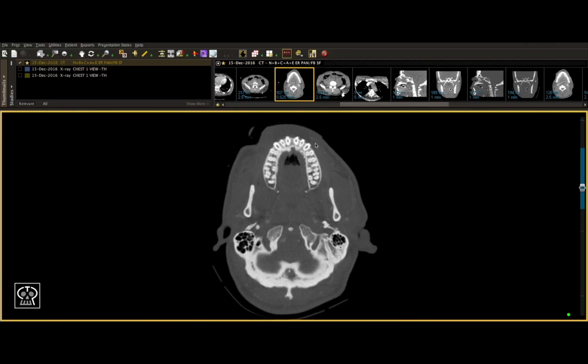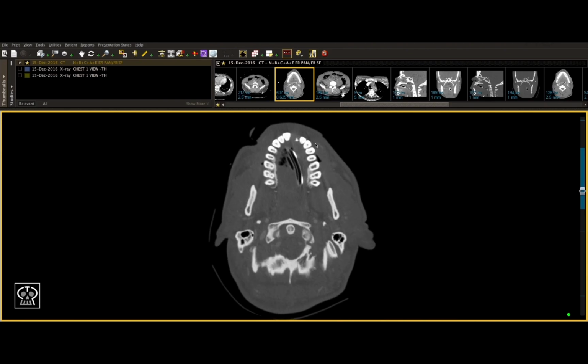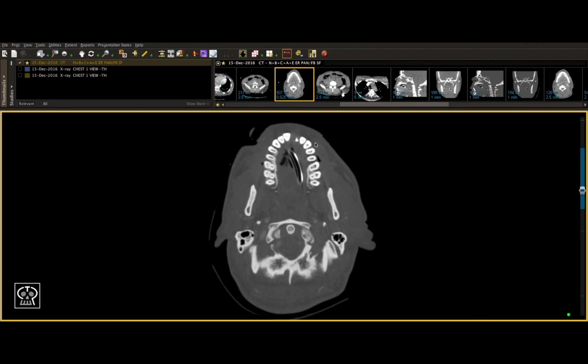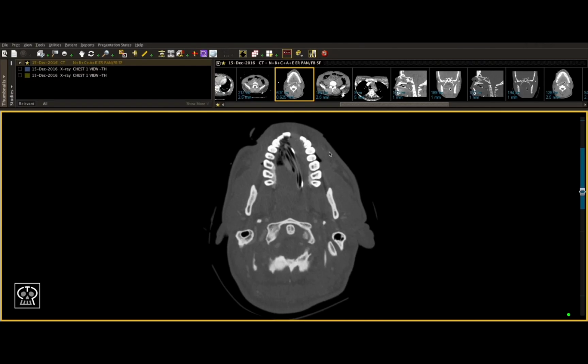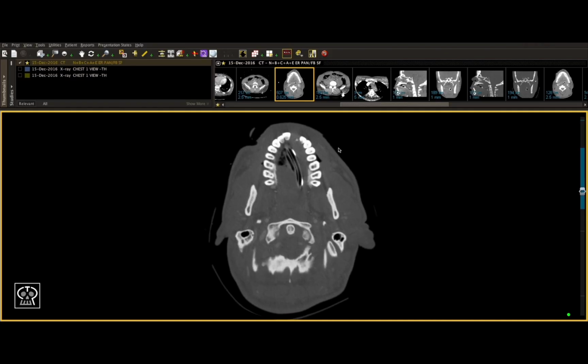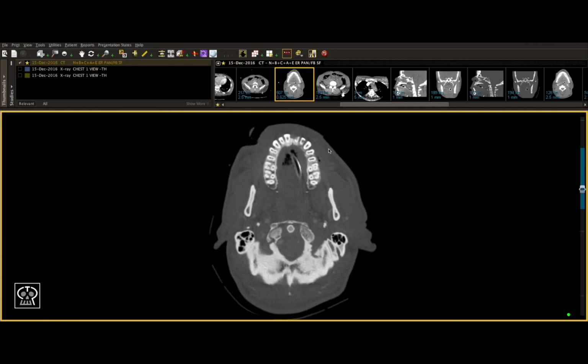Remember, it's not always important to identify which fracture you have right away as soon as you see it, but more just to recognize abnormal from normal. Right away, we can see that with teeth 2-1 and 2-2, there seems to be something abnormal. After I've scrolled through the rest of the scan following our normal protocol, I've determined that there are no other fractures except I think something's going on with 2-1 and 2-2.